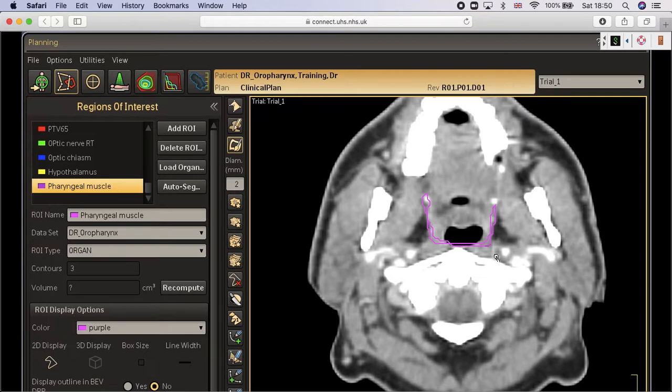But you wouldn't take the prevertebral muscles. So you don't take the prevertebral muscle. It's just 2 millimeter thickness, okay? U shape, it's for us, okay? So the upper part of the superior pharyngeal muscle will be U-shaped. When you go down, you will see that it will start to be V-shaped. Look what will happen, okay? Let's focus on this side, okay? So the starting point was very important for me because it's U-shaped, it's easy to detect, it's easy to draw. That's it. It's very simple.